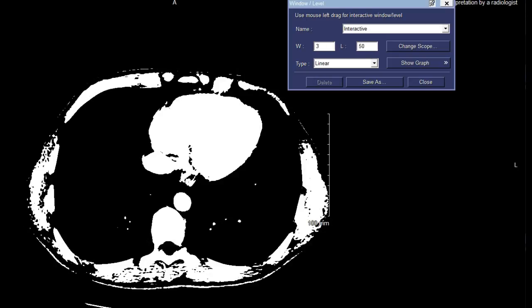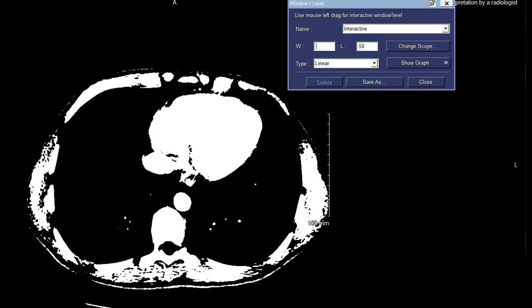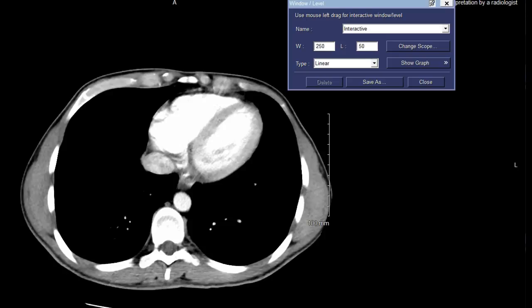We're getting smaller and smaller, with fewer and fewer grays for each of these visualizations. So it's a balance. We have to see the appropriate amount of grays to see the structures of interest, but the level also has to be set towards that structure of interest. Hopefully, between the combination of videos between the chest and the head, these concepts are now nicely reiterated for you.